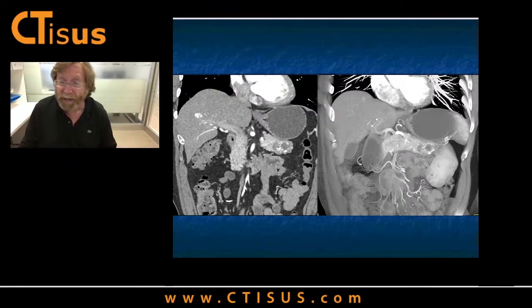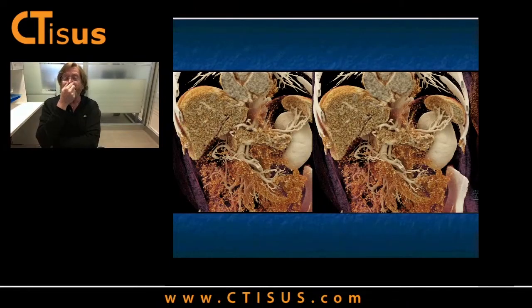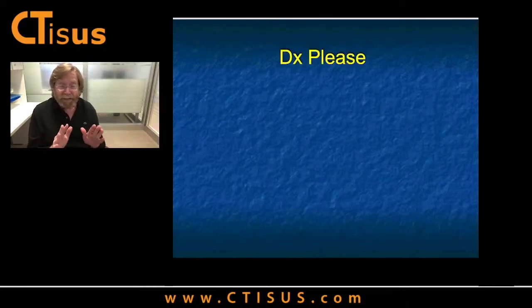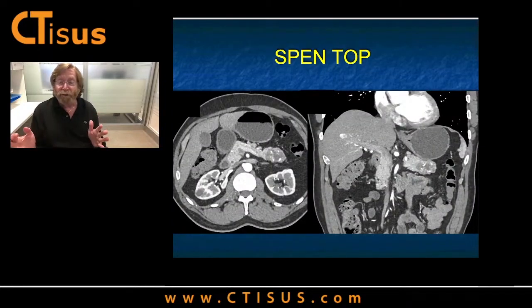So now you put your thinking hats on again. Here it is again, cystic calcifications, vessels are displaced. What could this be? I'm running out of time. You're at the jump shot. You're number 23, Michael Jordan. You see the basket. You fake left, you fake right. You scream out, SPEN tumor, and you're right. Solid pseudopapillary epithelial neoplasm of the pancreas.